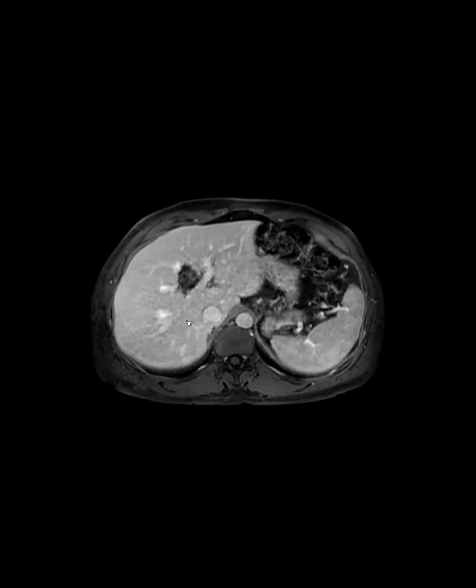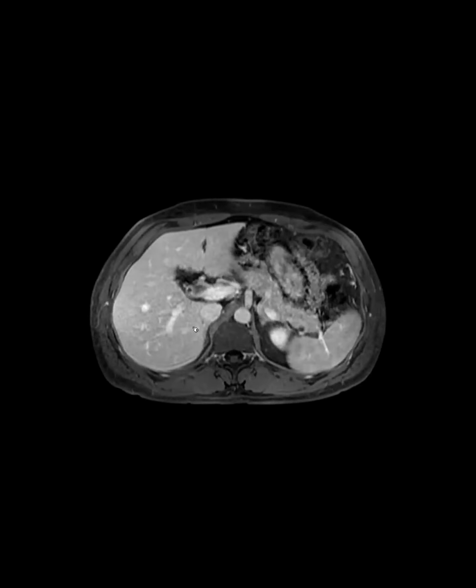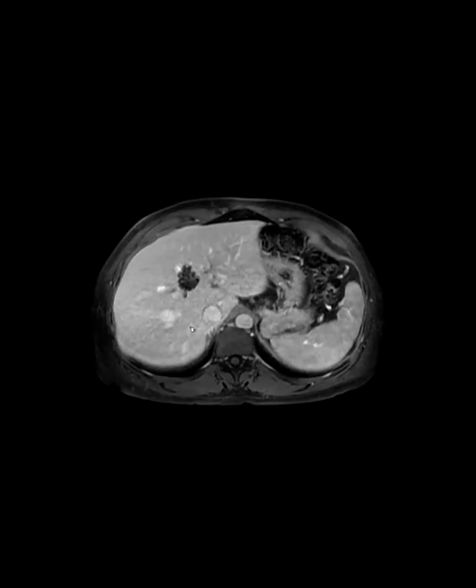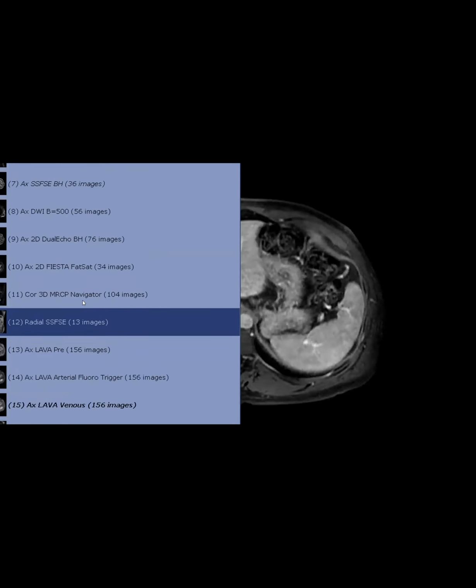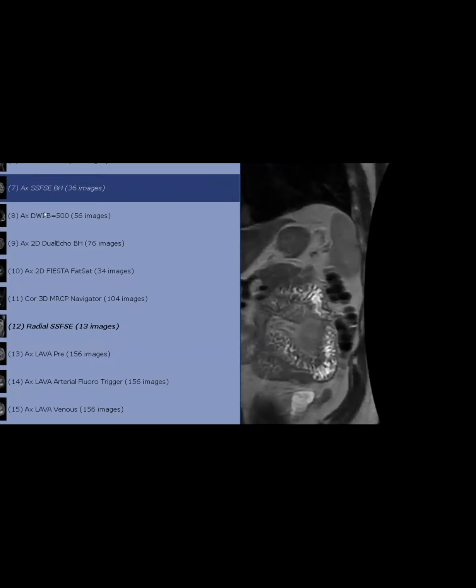It turned out to just be hamartomas and peribiliary cysts. So I do think in retrospect, an EOVist would have helped us. If we didn't see it communicating, we might have suggested it. I wanted to show this to show that biliary hamartomas aren't always fairly well-defined. They might even be tubular and multicystic looking.